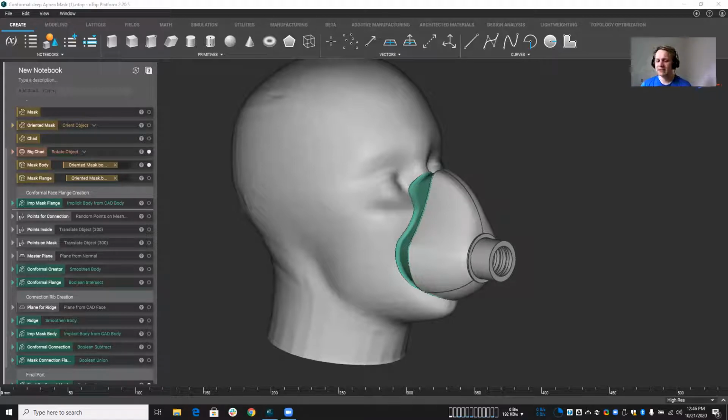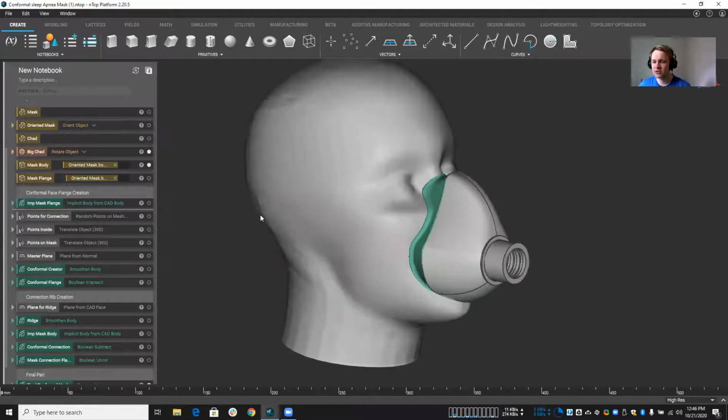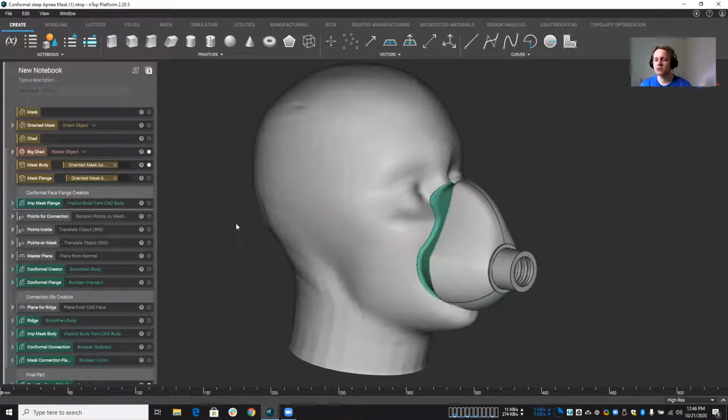All right, welcome everybody to this nTop Live, where we're going to talk about the creation of a conformal sleep apnea mask. I'm pretty excited to be here talking to you about this one. I think it's pretty interesting. What you're looking at on screen is our end result. So this is what we're going to get. Where did we start? Well, let's take a look.